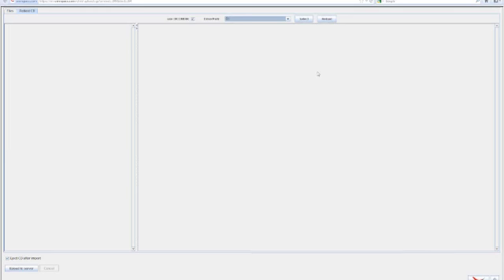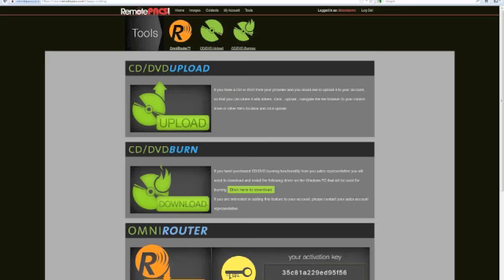The other thing you can do is select studies from your local hard drive. So if you have 100 studies in your local hard drive, you can select them all and upload them directly from here without having to have any additional software. And this is included, again, for free in every account. It's an easy way to get your studies in there, especially when you're getting images from a patient who had the study done in another facility. You can import them right in and view the image for that patient side by side with any newer prior studies. I'm going to go ahead and close this.